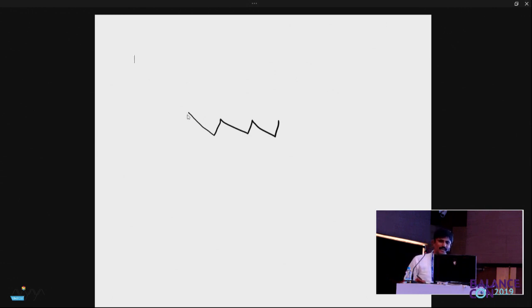This means the eye is going downwards, then the eye is going upwards. Which is slower? This is slow, and this is fast. So which direction is fast? Up. So this is an up beating nystagmus.